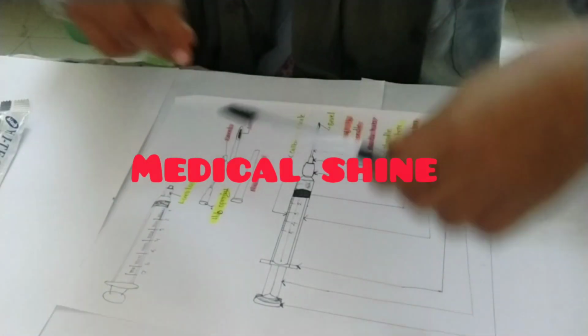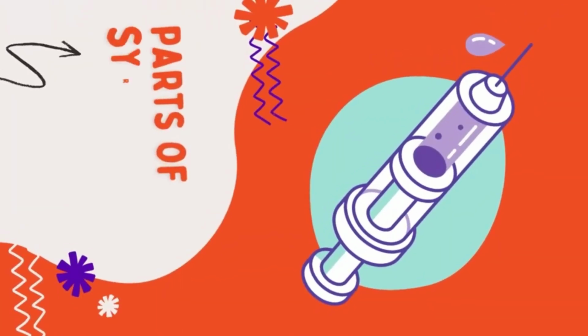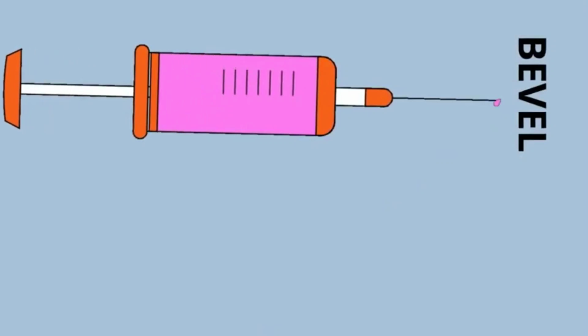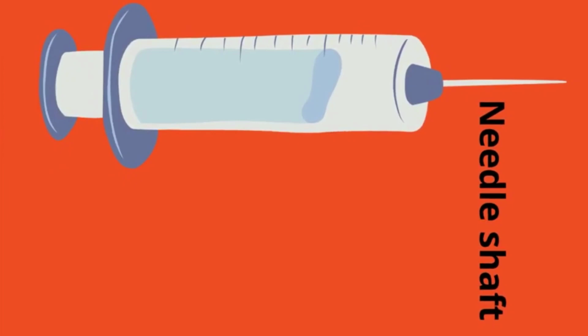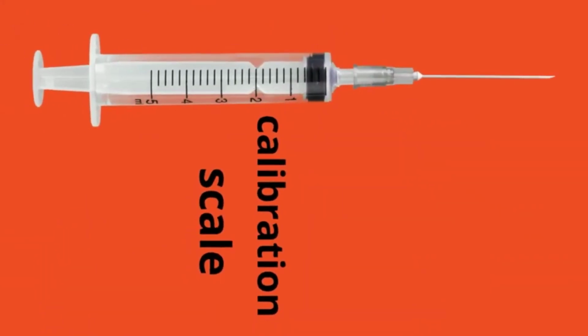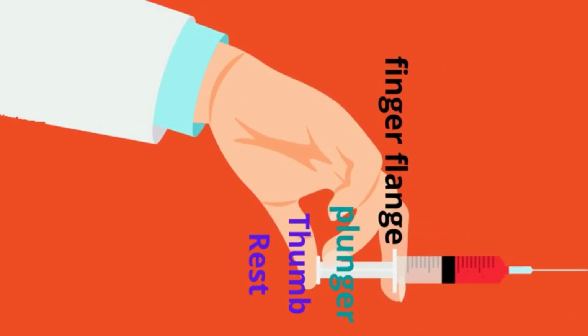This is Mohida, coming up with a new video discussing the topic of parts of syringes and needles. What are the parts of syringes and needles? As we know, this is the most important topic in the medical field. A doctor, a nurse, a physician, a physiotherapist, or a pharmacist must know about the parts of a syringe and needle. I will explain it in a simple and easy way so that you can easily remember.